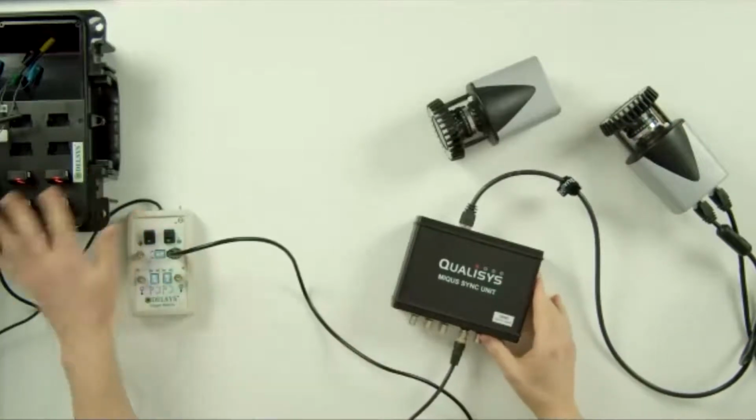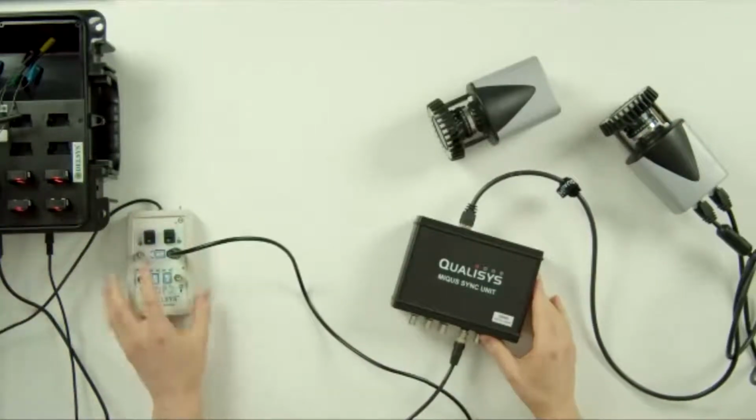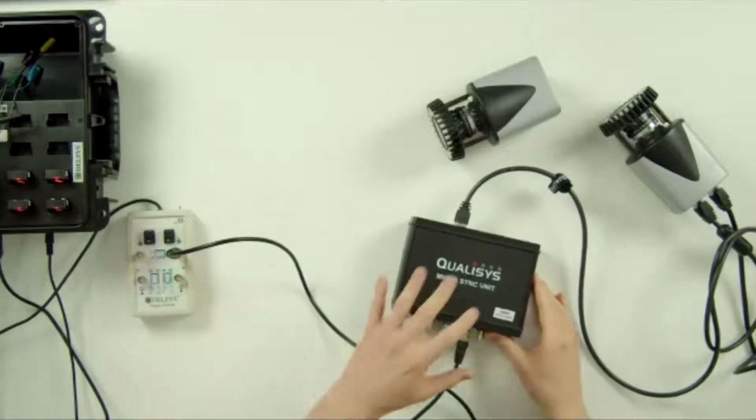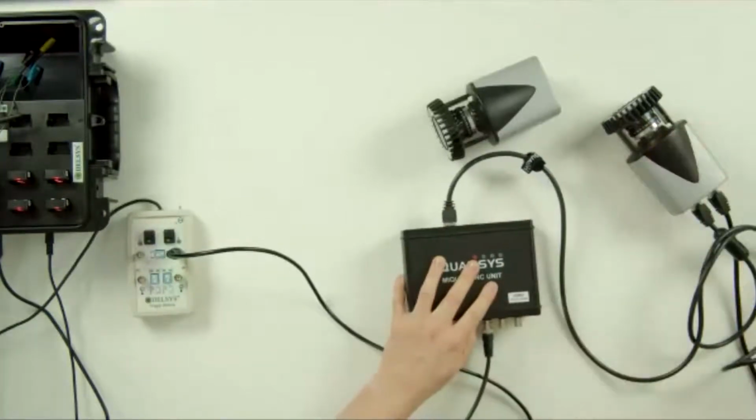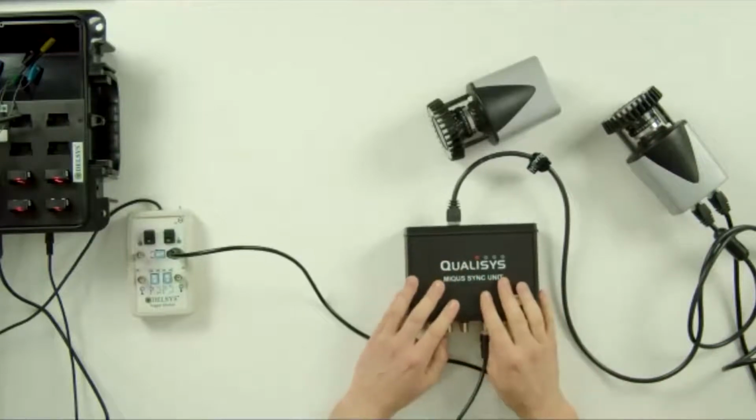But we have our Delsys system powered, connected to USB and to our trigger module. Our trigger module is then connected to the camera sync unit, which is then connected to the camera, which is connected to the computer and to a power unit. And I'm hopefully Niels can give me top marks for connecting my Qualisys system together. Absolutely. Well done, Steven. That looks perfect.